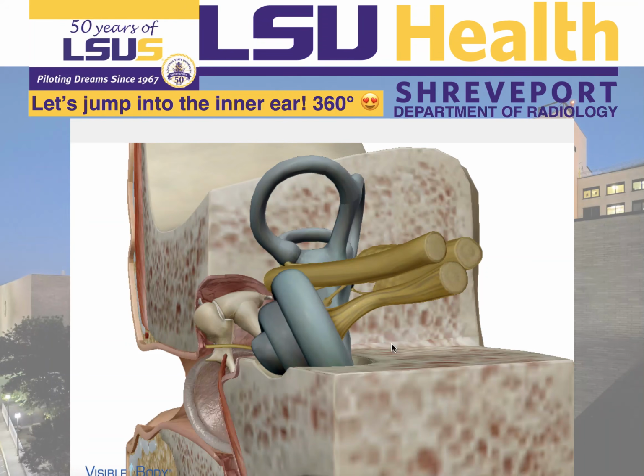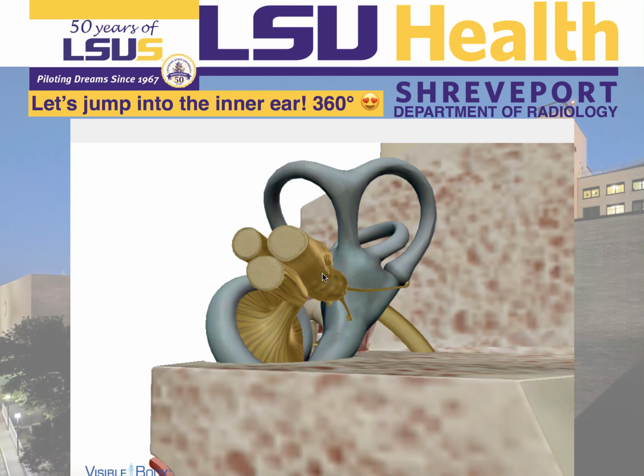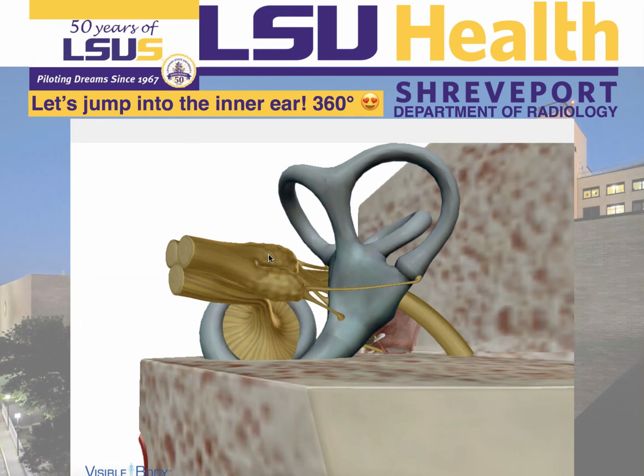Here you can see perfectly the nerves that pass through the internal auditory canal. This is the facial nerve. This is the cochlear nerve, and this is the vestibular nerve that has its superior and inferior portion. Always remember that the vestibulocochlear nerve is thicker than the facial nerve because there are two nerves in this one component, okay? The vestibular and the cochlear nerve, so it's thicker and it's posterior in relation to the facial nerve.